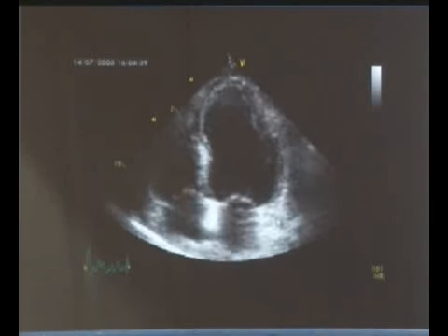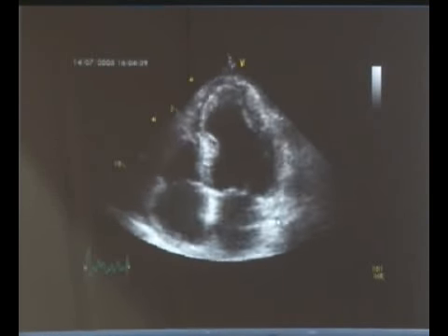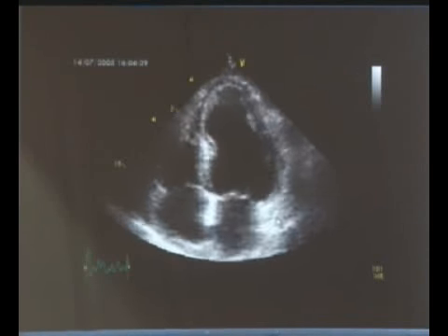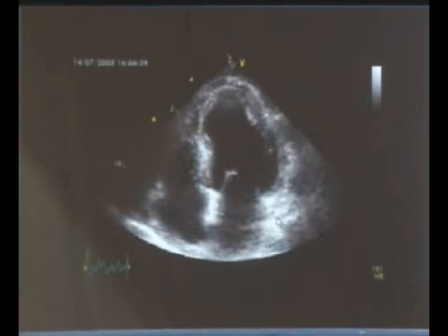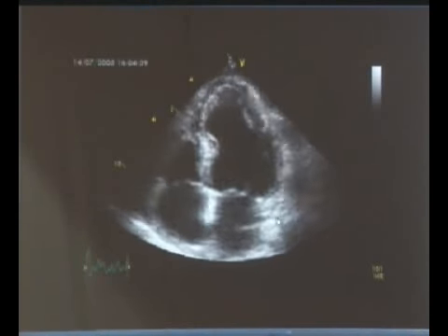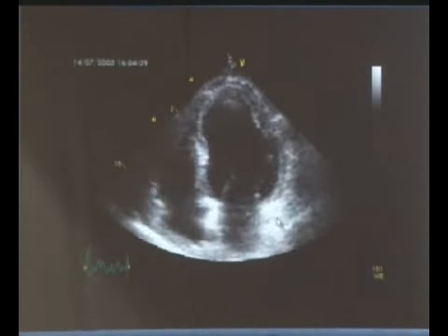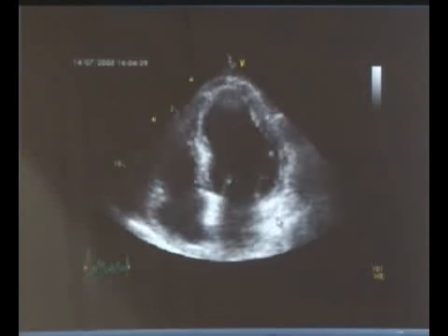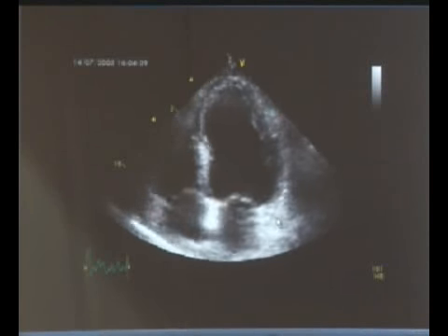Or if you have a sinus bradycardia or a complete heart block, you are triply sure. So, whenever you look for right coronary wall motion abnormalities, you should always look for right ventricular contraction. I will show you how.